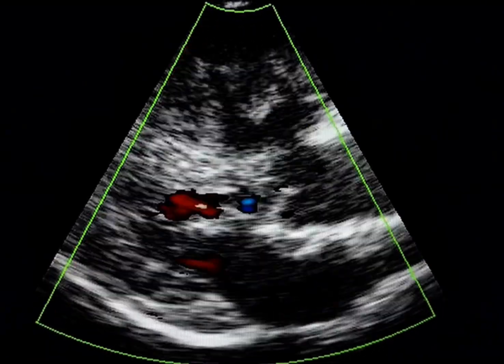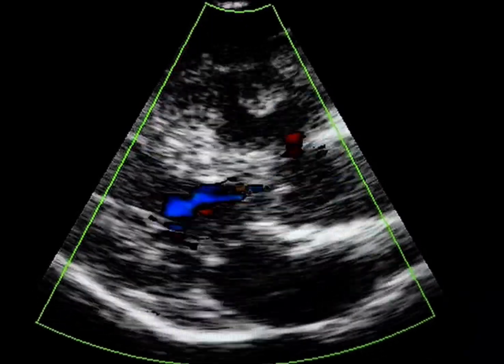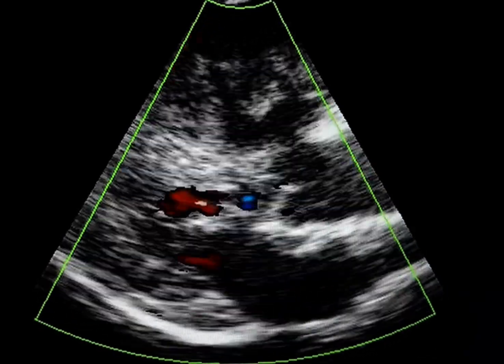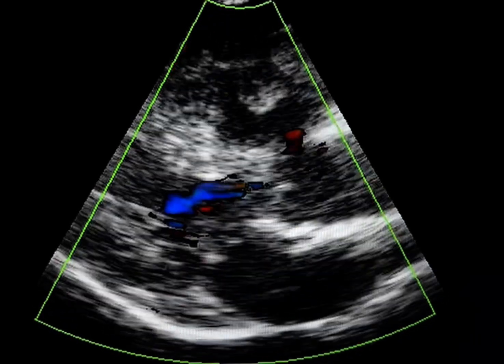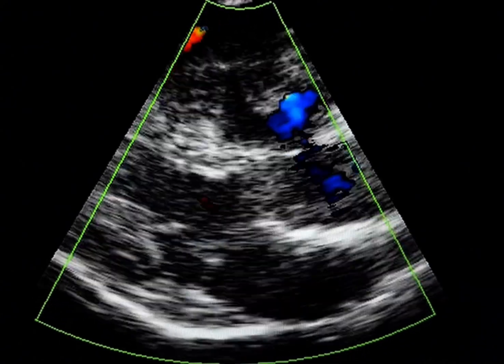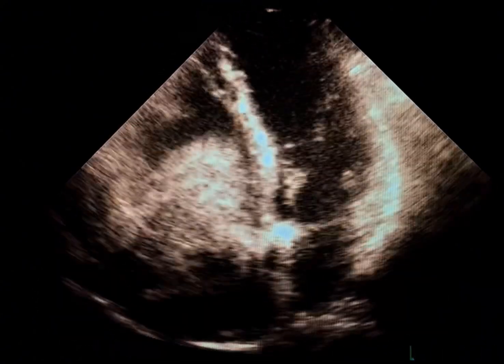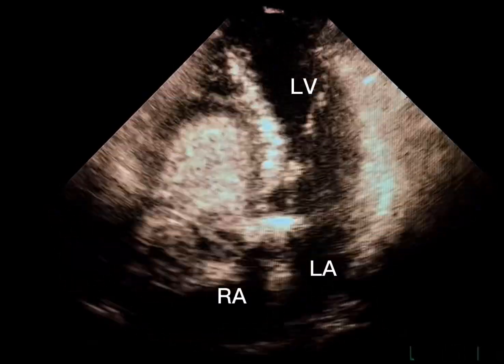It is important to note that a large mass in the right ventricle or its outflow tract isn't always a primary RV tumor. Sometimes it can be a structural abnormality that mimics a mass. Now let's review some common RV masses that can appear quite large.